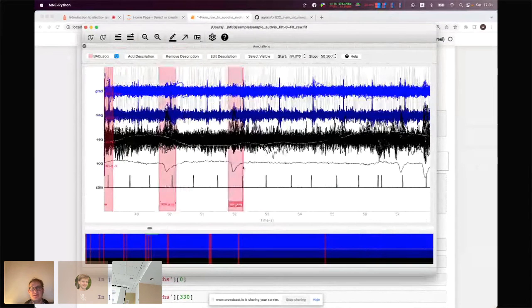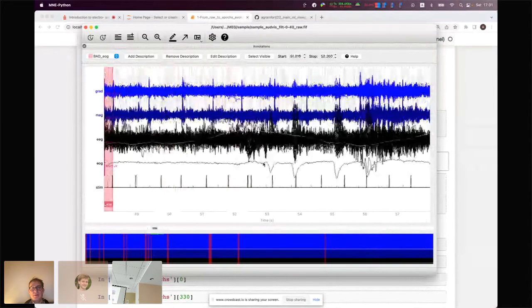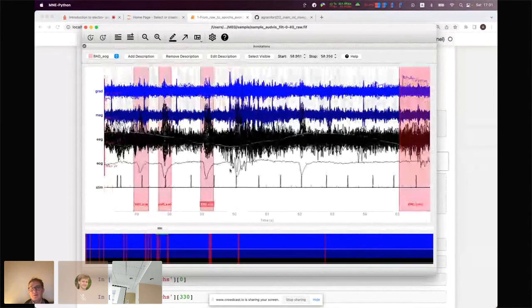Okay, it's still downloading. For me, it worked on Colab. When I opened it on Colab, it kind of downloaded in a minute. Yeah, on Colab it will be fast.